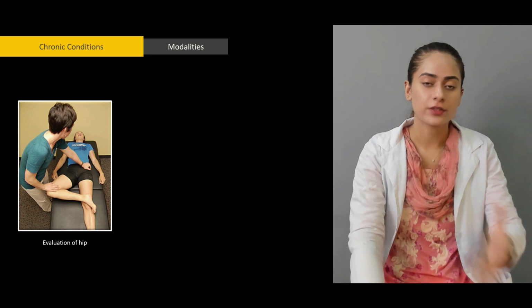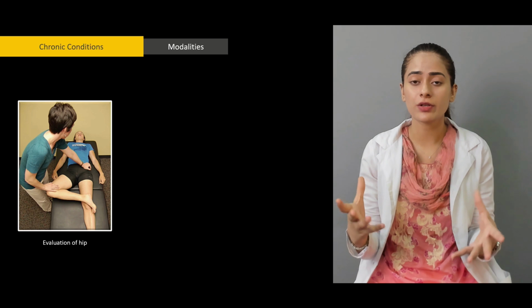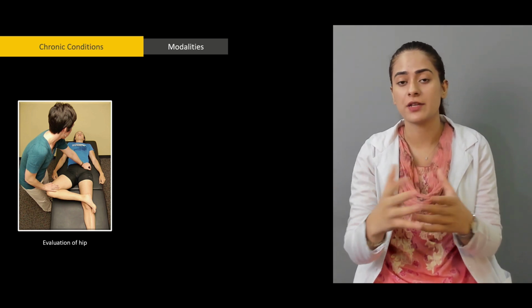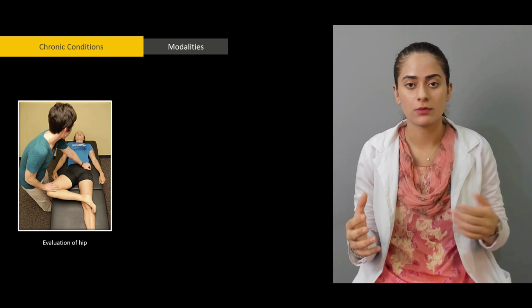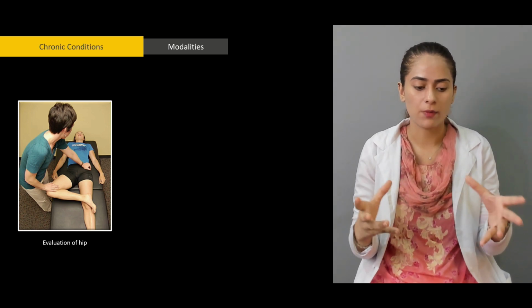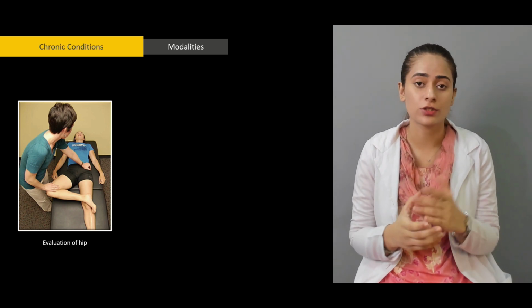So you evaluate the hip if you suspect any chronic condition, because in an acute condition you really don't need to evaluate the hip and ask the patient to perform certain movements unless you're expecting some minor fracture. You actually do perform some of the movements to comment if there is a fracture, because movements are really painful in acute conditions as well.